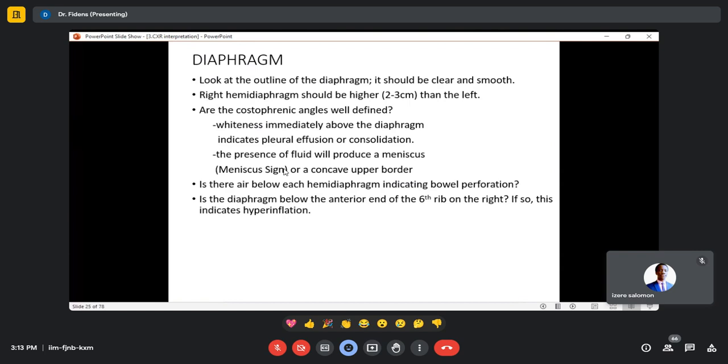It's a sign of pleural effusion because you can see the same opacity without a meniscal sign, and they don't call it pleural effusion. Pleural effusion has a meniscal sign, especially if the amount of fluid is enough. You see a concave line, and the upper side is the lateral aspect, and the lower part is the medial aspect of that line.